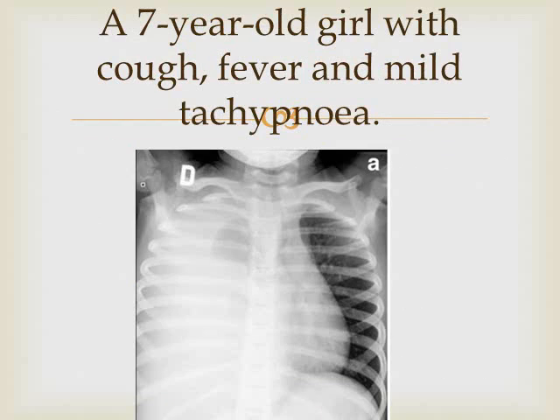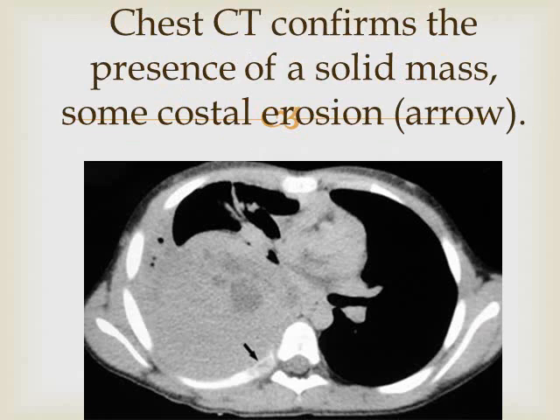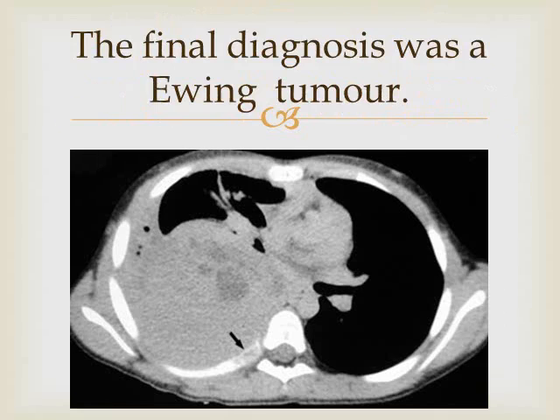Here is another child who presented with cough, fever and mild tachypnea. And the chest CT confirmed the presence of a solid mass with some costal erosion. So the final diagnosis was Ewing's sarcoma, Ewing's tumor.